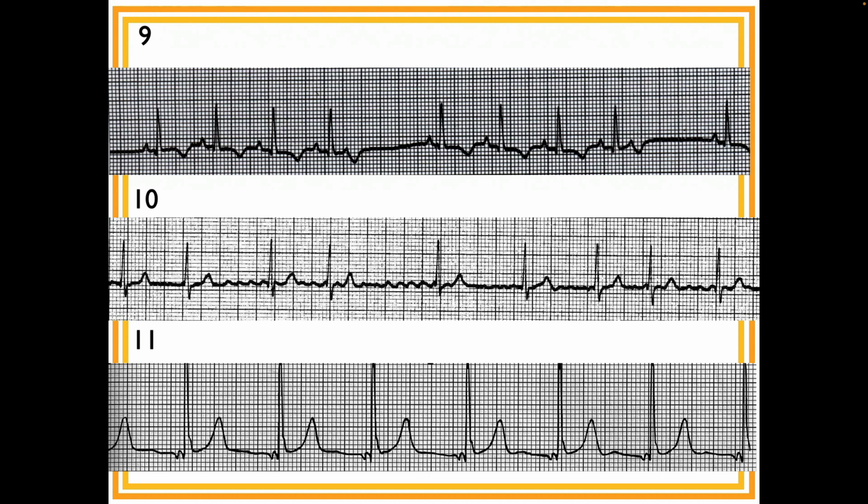Great job. So what was this rhythm? It's a normal sinus rhythm with 2 non-conducted PACs. Okay, next one, please.